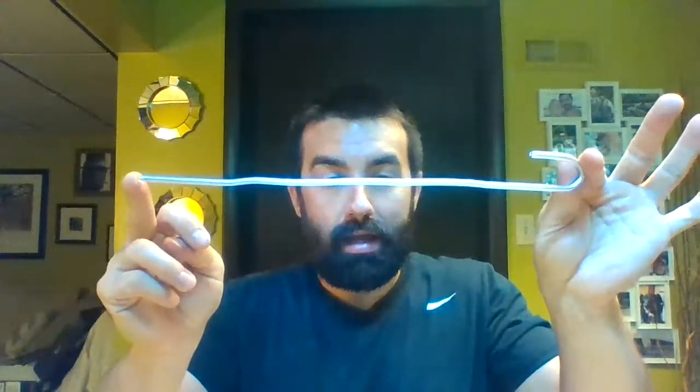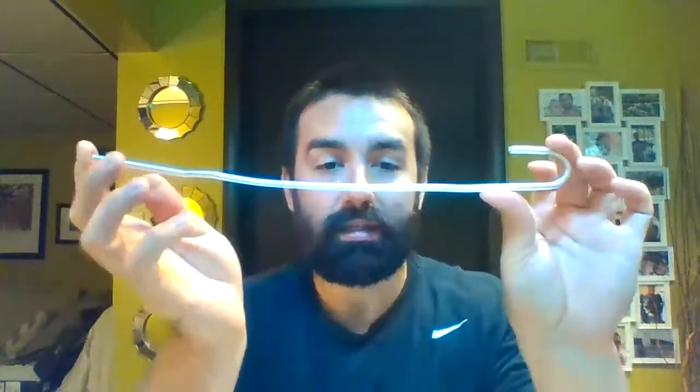A stylet. A stylet is almost like a malleable coat hanger type thing. This is for easing the insertion of an endotracheal tube during oral tracheal intubation. We don't use these for nasotracheal intubation. Essentially, a stylet gives a little bit of rigidity to the ET tube instead of pushing it through and the thing bending over on us. It goes in through the 15-millimeter adapter. You push it, make sure it's not sticking out the end, but it needs to be fairly close.